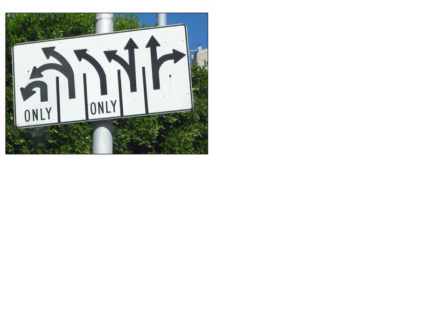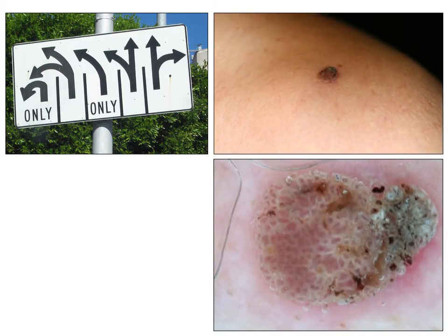But unfortunately, this is a confusing image because it's not specific. Papillae are also prolongated in different entities, all keratinizing tumors, including seborrheic keratosis. So in seborrheic keratosis, you will see exactly the same image.